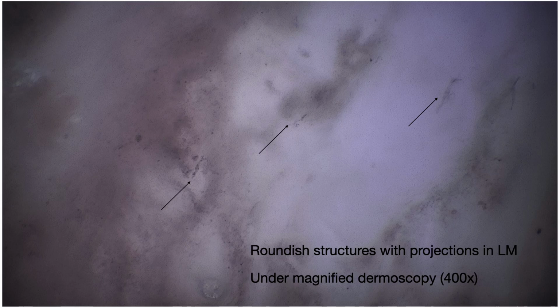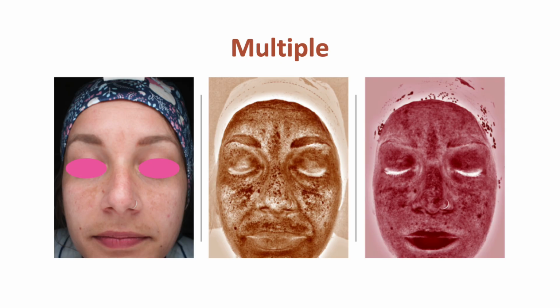Of course, the visualization of these features can be really difficult for beginners, so you should explore the lesion overall, and then you might be able to find this feature that can confirm and support the diagnosis and the path of the patient towards the final diagnosis.